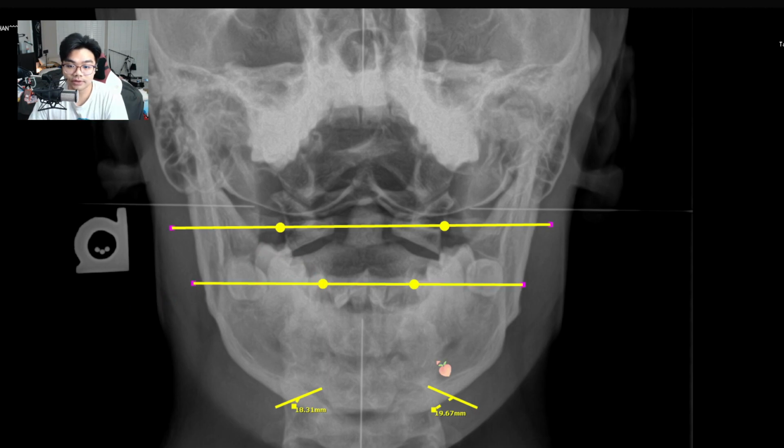To get our fourth and final listing, we have to base it off of our previous listing, which was a right lateral atlas. So now we're listing the right side of the atlas, right? We have to take measurements of the lateral masses here.